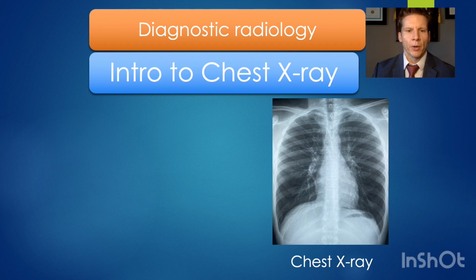There are many different approaches that have been described for chest x-ray interpretation, including the inside out, outside in, A, B, C, D, E, different things that you may have heard of. I've seen those letters taken out even further than that before also. Let's try to simplify things and keep it basic so that we don't get too bogged down with extraneous details that we lose sight of the big picture and the key concepts of what we're trying to evaluate.